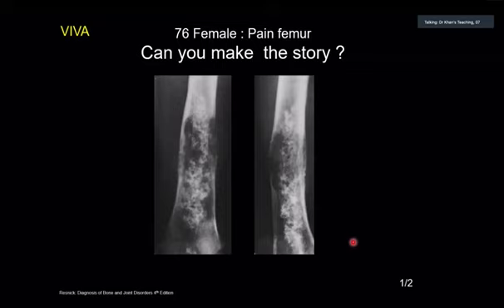What else can it be other than a bone infarct with malignancy? Enchondroma is another suggestion. In an enchondroma you can get expansion, and the expansion is there. There could be a fracture through the enchondroma, but I would not expect to see the periosteal reaction. Enchondromas can have malignant transformation, and in that case periosteal reaction would be there. So the other differential would be enchondroma with malignant transformation. These are my top 2 differentials.